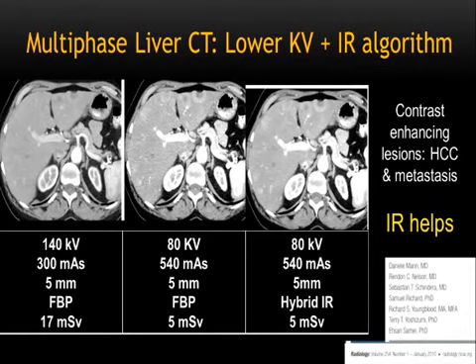And again, the doses are fairly low compared to 140 kV, which is not something that I would have recommended as a starting point. Unless the patient is 300 pounds or greater, morbidly obese or severely obese, for all CT angiography studies, I would have stuck to 120 kV. Right? Unless you're scanning maybe a borderline obese patient and your scanner did not allow you to go beyond 400 mAs or so, which can happen in the older scanners. So this might have been one of those.